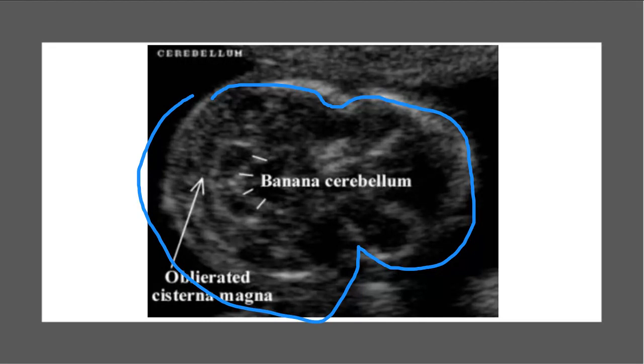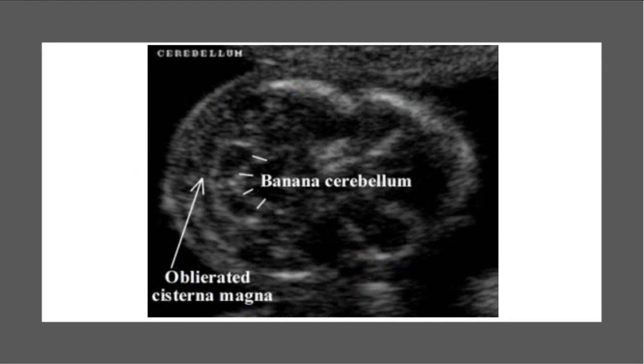Like we said, craniosynostosis can be isolated, but that's usually not going to be the only thing going on with it. So Arnold-Chiari: abnormal cerebellum, abnormal fourth ventricle, kind of like Dandy-Walker, right? Dandy-Walker had to do with the fourth ventricle and the posterior fossa as well, but that had to do with the cystic dilation of the fourth ventricle that then produced those byproduct problems, right? We didn't have the cerebellar vermis. We don't have the normal posterior fossa. We don't have the normal cisterna magna. It's all replaced by that dilated fourth ventricle.